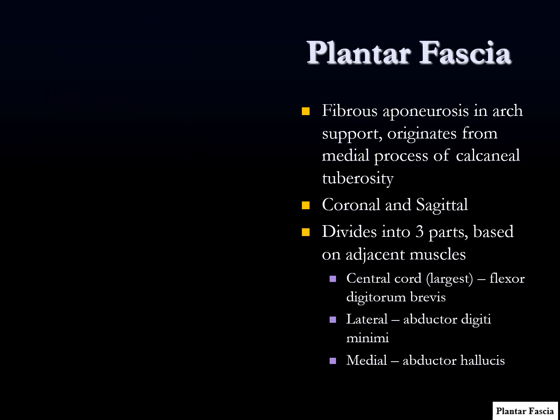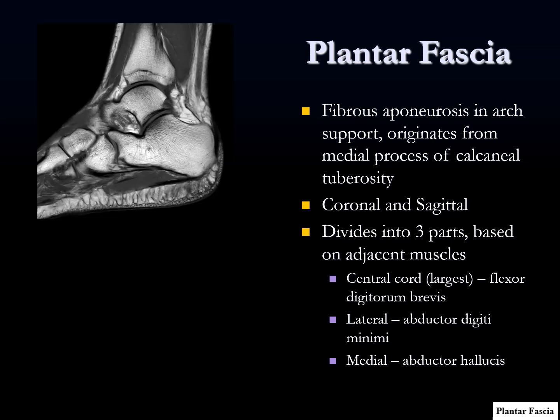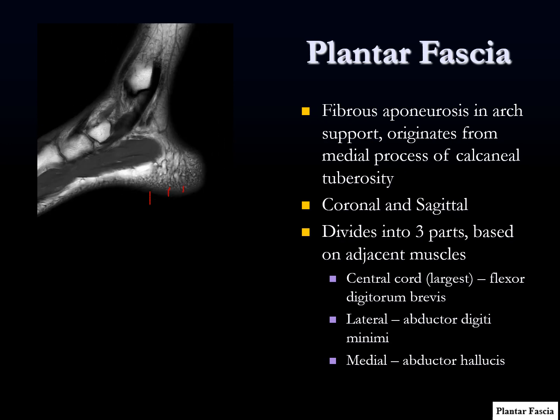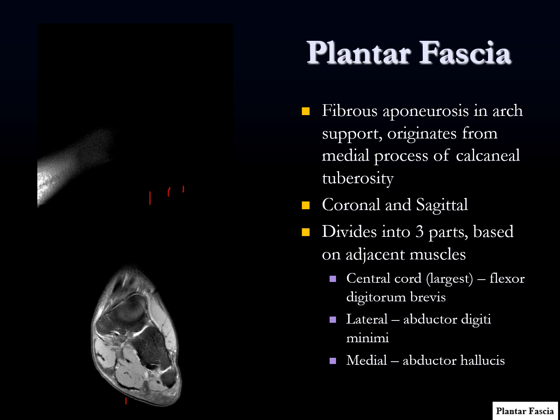All right, so let's look at that on images. Start with the sagittal images, and you see nice dark thin plantar fascia inserting where it's supposed to. Nothing is too thick. Looks normal. And here's our coronal, so we're going to follow this out.